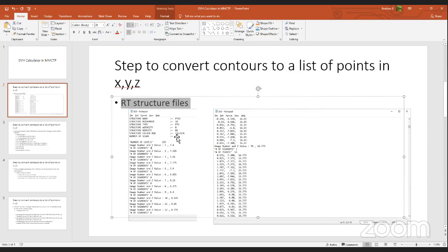There are some identifiers here that come through from DICOM, and the color and the number of scans represents the number of CT slices. For each slice, there's a row and line entry. So you have, again, the number of slices, 233, and it starts going from slice 1 all the way up to the end. Slice 1 starts at a Z position of 7.4, and there are 0 segments in slice 1. Over here is where you start to see some contour points for that volume of PTV1.